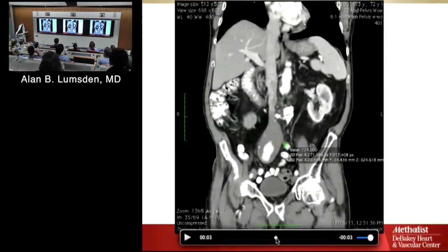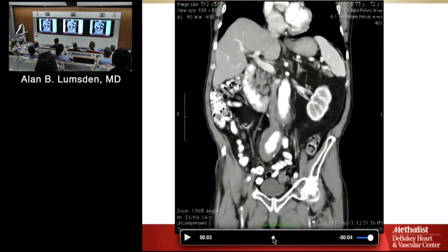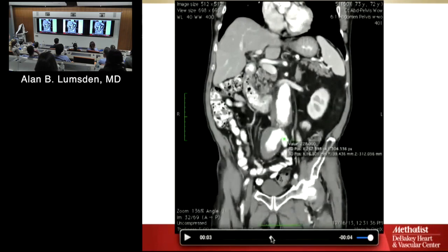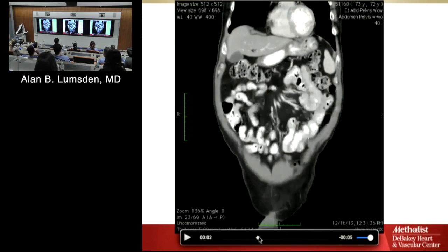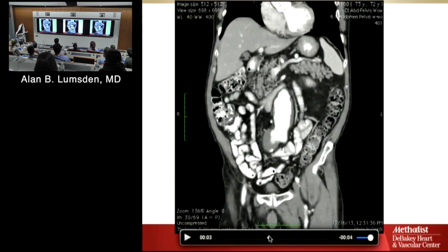So look down there, aneurysm. It's got dye in it this time, okay? That's the difference between what I just showed you, the non-contrast scan, and the contrast scan. Now you actually get to see everything really nicely. What I was going to show you is the fact that the left common iliac vein goes behind the right common iliac artery and gets compressed. That's called May-Thurner syndrome. You will see that. That's why DVTs are more common in the left leg, and varicose veins are more common in the left leg. Okay, so this is the contrast scan, showing the inside of the aneurysm.